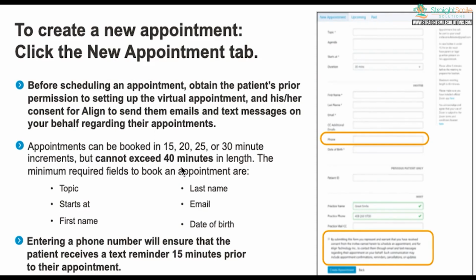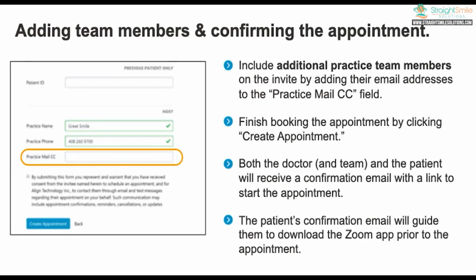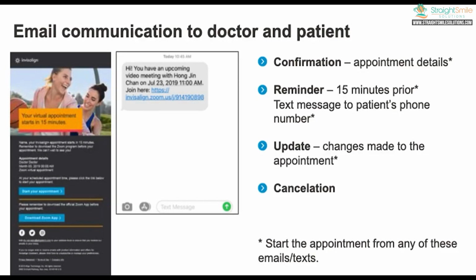I would definitely book yours all at 40 minutes if you're going to use this service, because I'm going to tell you what's going to happen. If you do a shorter one, it's going to get totally cut off. So you got to put some basic patient information in. You can go ahead and create the appointment. You'll receive a confirmation. Patient will receive a confirmation. You both need to click on it.